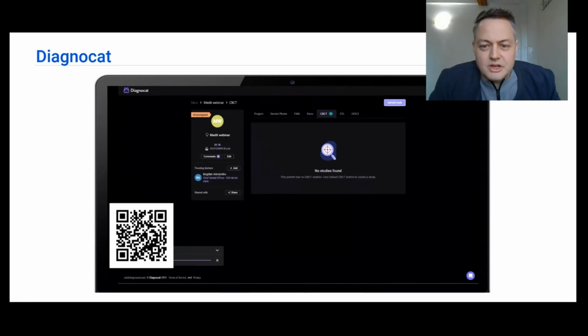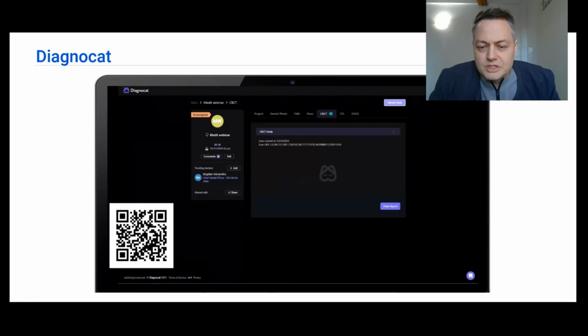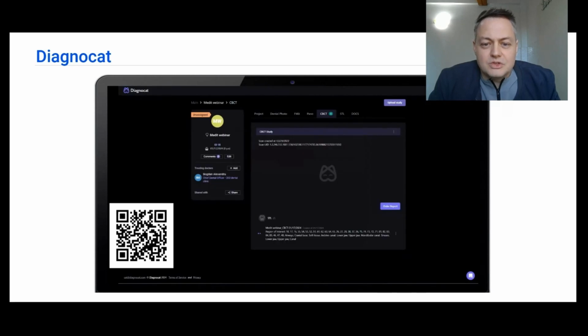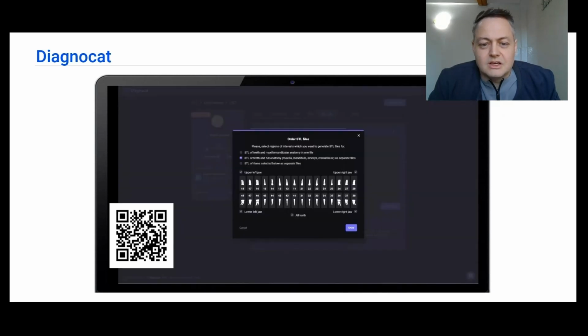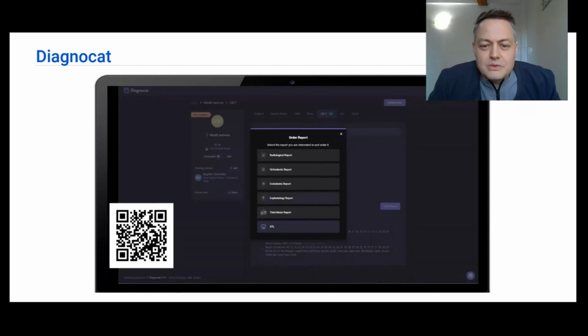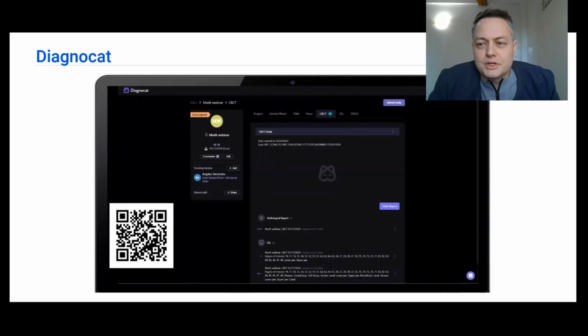And immediately after uploading, you are going to be able to order reports. And what is interesting here, usually I was just getting the STL part, as you can see here, and ordering every structure of the STL separate. And also I'm going to order one more time with the structure merged. And after I do this, I found out that I can actually also order a radiology report. And this is when I think things started being interesting for me. And in the next slide, you'll see why.